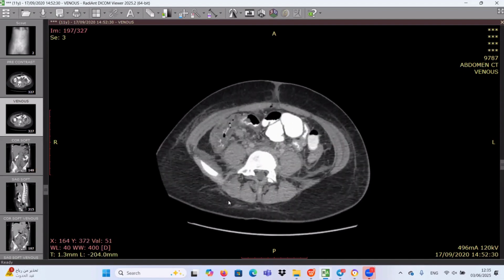Once we have appendicitis, it can be associated with mural thickening of the colon secondary to complicated appendix. So this one is bacterial peritonitis as a complication, either from appendicitis or from the surgical interference. Surgical complication.